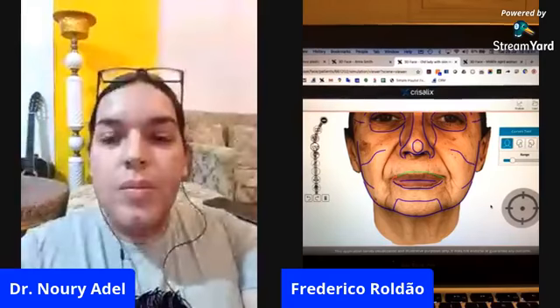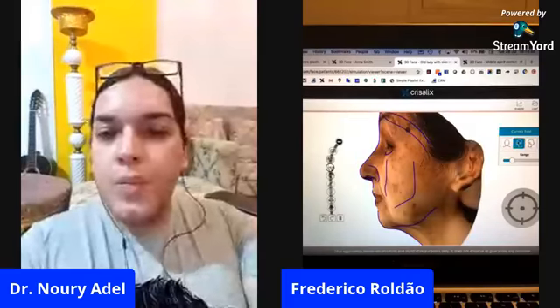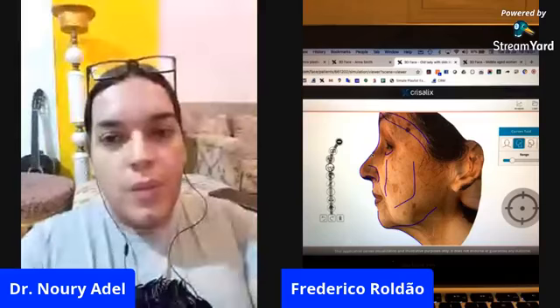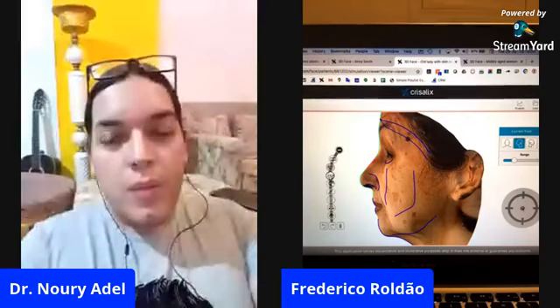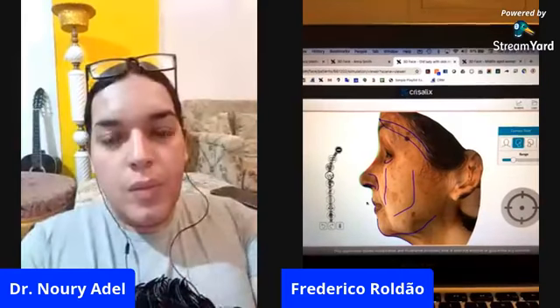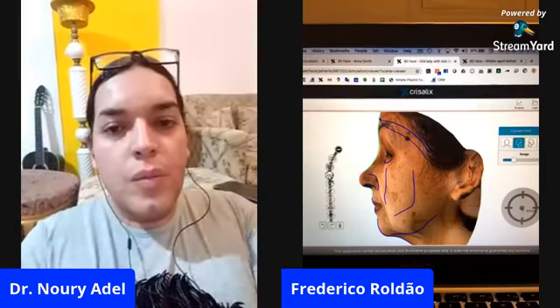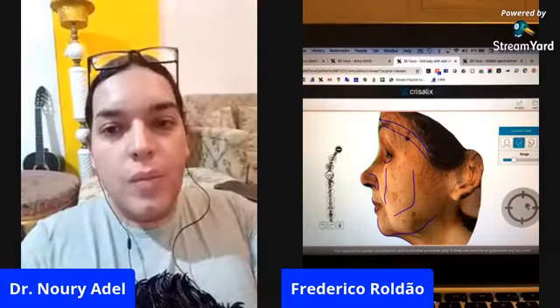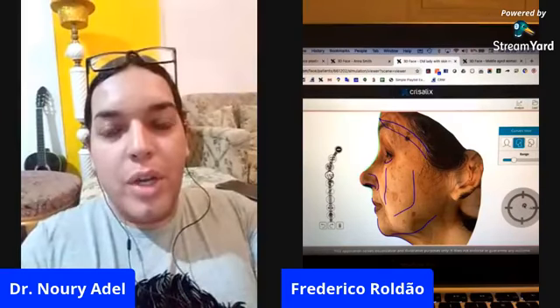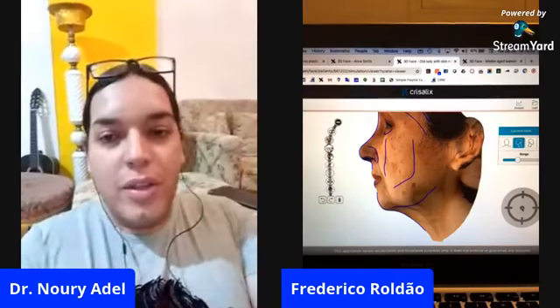Yeah, yeah. So I will now change my angle and I will go sideways like this. Okay. And I will go here on the dorsum and maybe lower the nose a bit like this. And I could play with the tip a bit like this. I don't know if you can see the tip changing. Yeah, you are pressing it in, and instead of it being very pointed, like this, yeah.